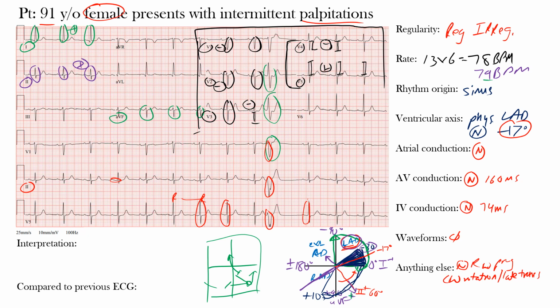You may hear of couplet PVCs, and that just means 2 consecutive premature ventricular complexes, or triplet means 3 consecutive PVCs. Okay. So hopefully that makes sense. Now there's one last thing that we can touch on. It's a little more advanced, and that has to do with where the origin of the PVC is coming from.